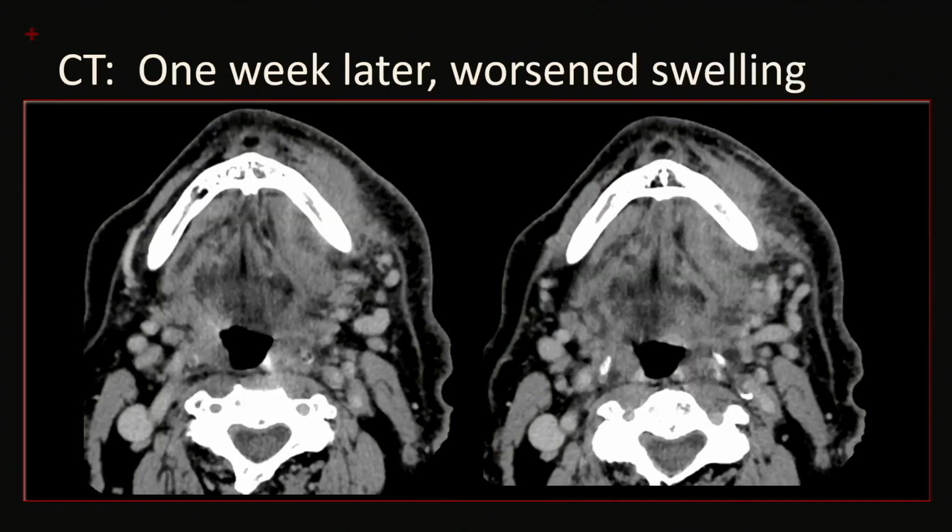Unfortunately, this person came back 1 week later, his symptoms were worsened. And if we look now, we start to see that the soft tissue thickening is deep to the mandibular body, as well as superficial. And we start to see a rim-enhancing collection develop.